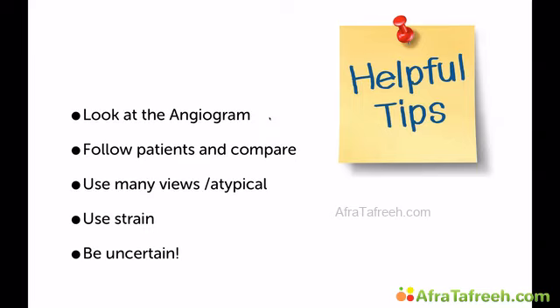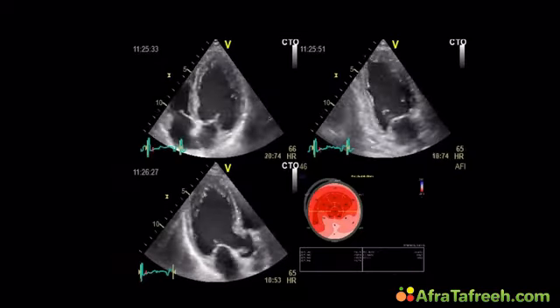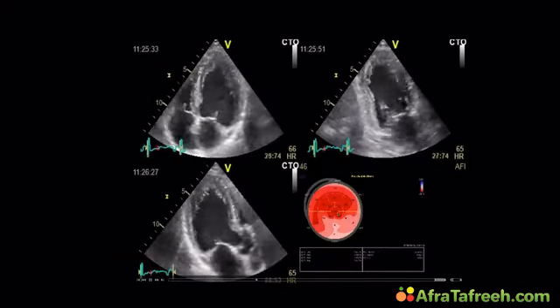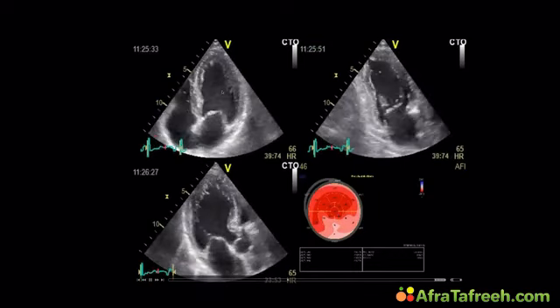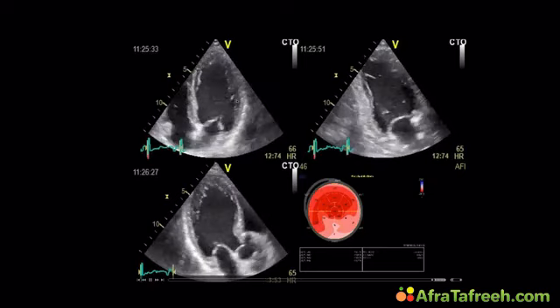Finally, there is just one other question which came in. How do we know the normal heart anatomy on speckle images? The normal anatomy is defined by the bullseye. Let me go back to this here. You have to look at it the following way. You see the heart here, and you spread the heart open.